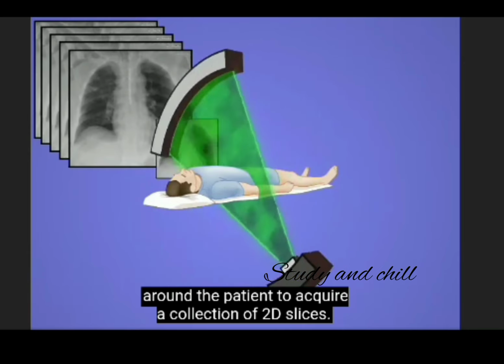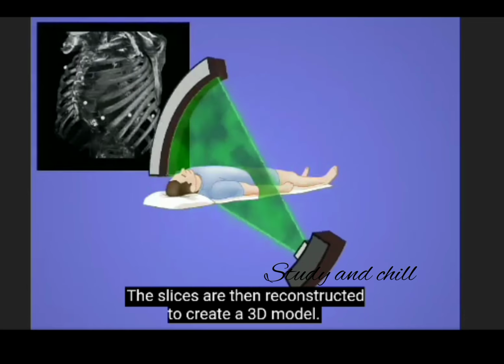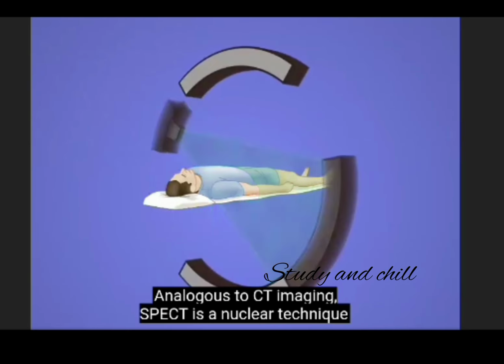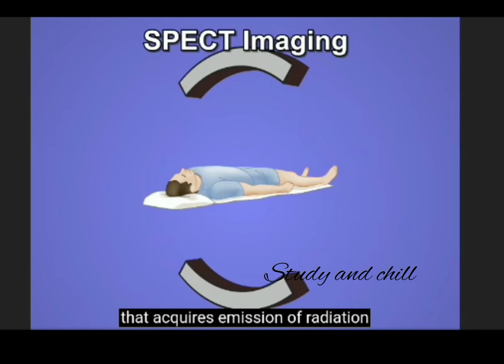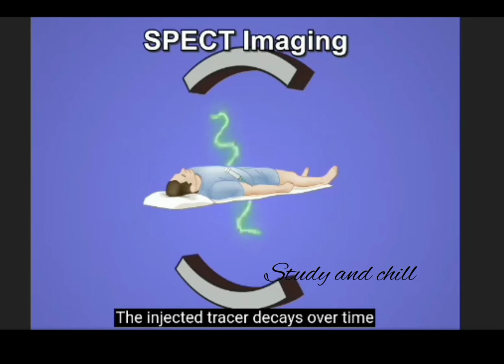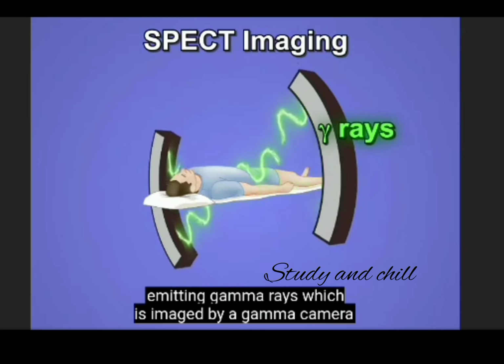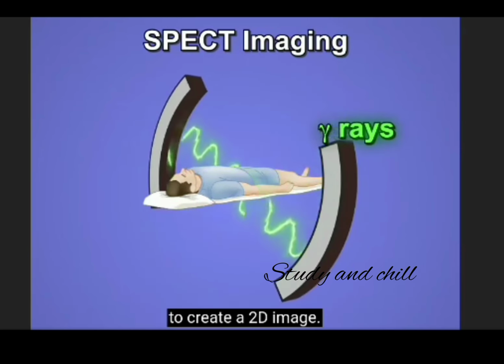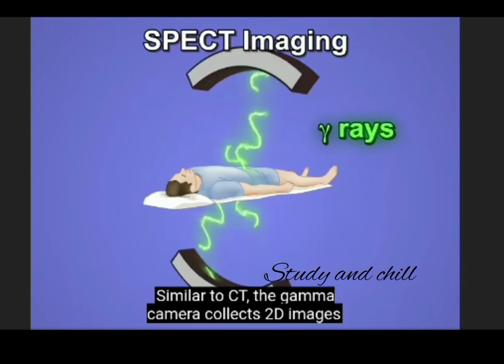Analogous to CT imaging, SPECT is a nuclear imaging technique that acquires emission of radiation from a radioactive tracer that is injected into the patient. The injected tracer decays over time, emitting gamma rays, which is imaged by a gamma camera to create a 2D image. Similar to CT, the gamma camera collects 2D images at various locations to generate a slice, which can be reconstructed into a 3D model.